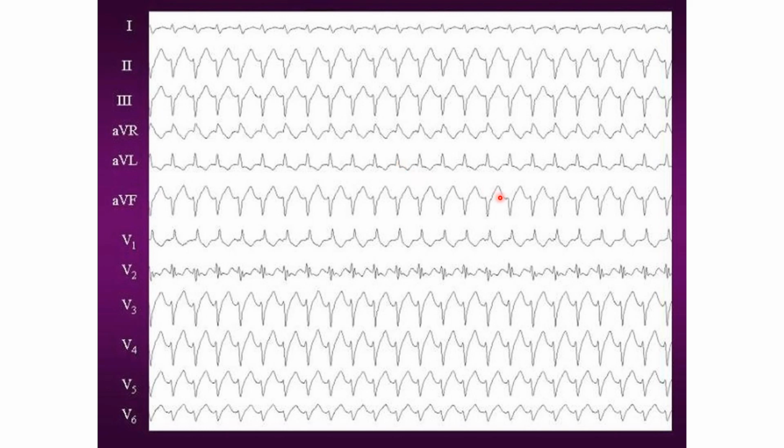But if you look carefully, there are some distortions seen. You can see one distortion here in the ascending limb of the T wave, which could be a dissociated P wave, but we will not be very sure about it. Then we look at this T wave. There is some peaking of the T wave. There could be a P wave there. If those are indeed true P waves, then that is one feature of AV dissociation. But we cannot be very sure about it.